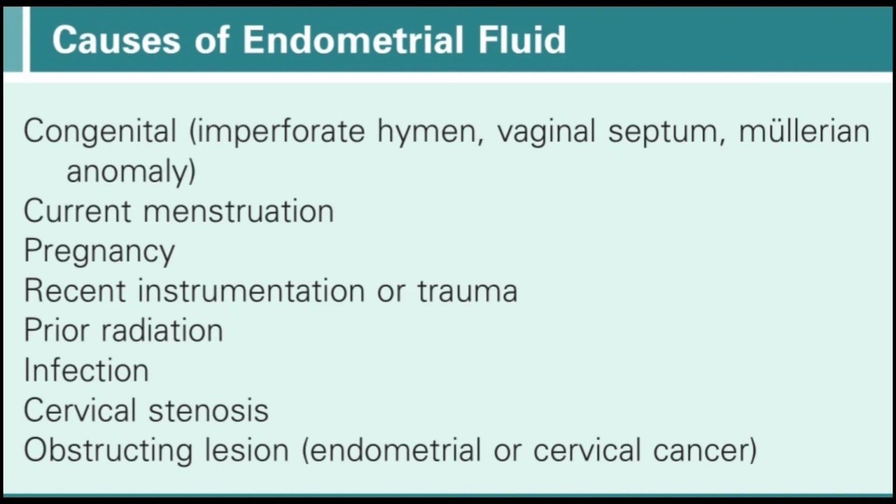In case of any obstructing lesions, whether these obstructing lesions are due to endometrial or cervical causes, there will be fluid within the endometrial cavity. So these are the differentials for the fluid within the endometrial cavity.